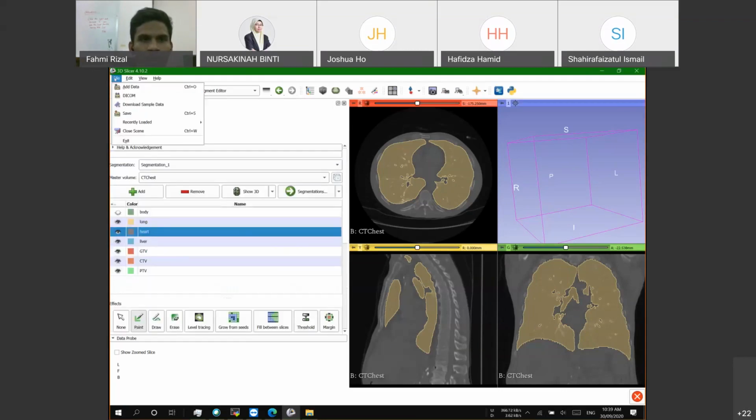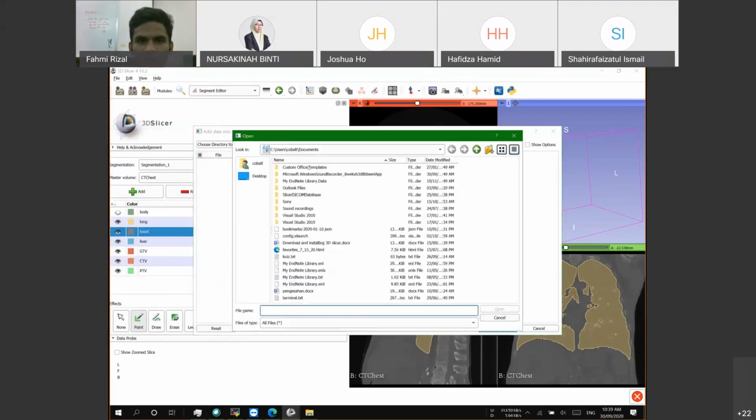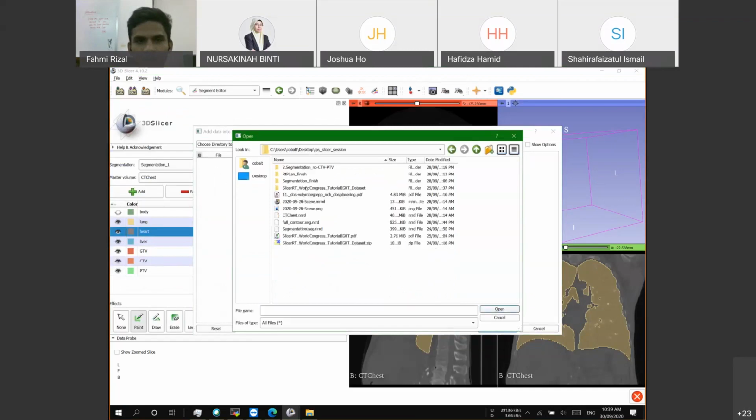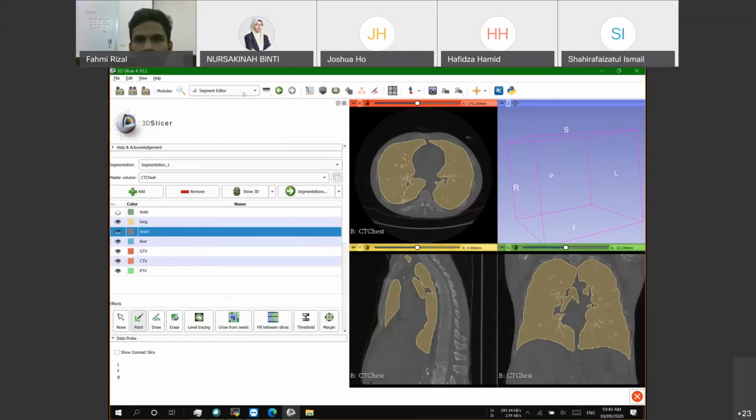I will show you what I have already done, because I want to skip time. So I think you can practice contouring by yourself after this.